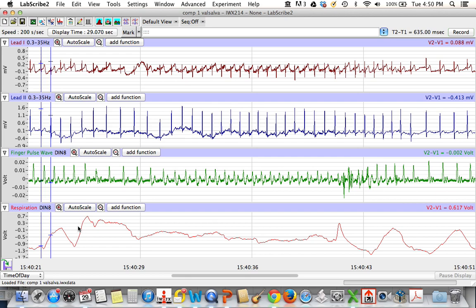In your figure, you're going to want to indicate where is phase 1, where is phase 2, and everything like that. So phase 1 is right at the onset of the pressure. So you're going to see that there's going to be a detection of, oh wow, I've got a lot of pressure that's building up here.